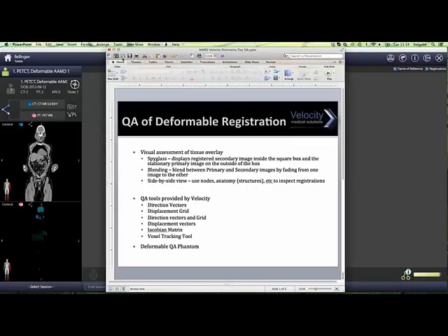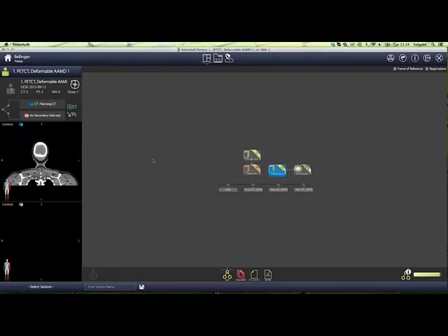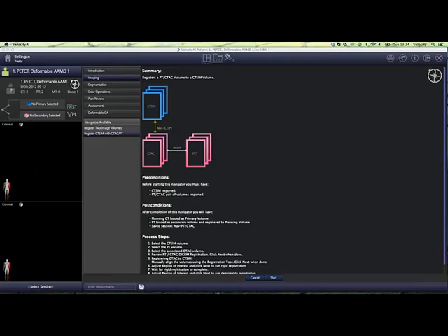All right, so when I click, I can just go through the instructions that are given to me in the top left-hand corner. I first select the images that I'm going to use. Once I've selected that, I click Next. I only have one PET, so the software knows that this is what it should use. It also knows that there's a DICOM registration between the PET and the CTAC. So once I've got those up, I can now review the DICOM registration between the CTAC and the PET.